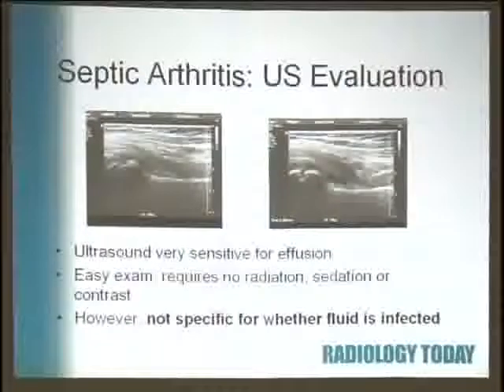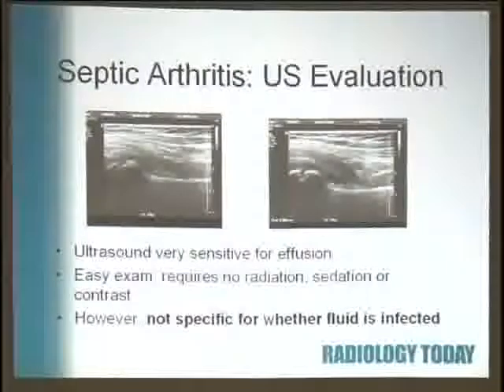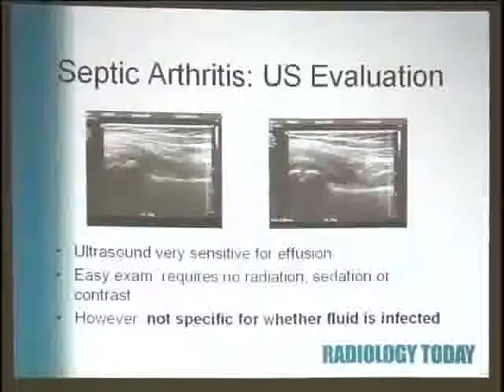This is a very binary test. It's a yes or no. When the child leaves, I am sure if they have a joint effusion or not. I like things like that. Medicine's got too much gray, maybe. But this will tell you yes or no, they've got a joint effusion.